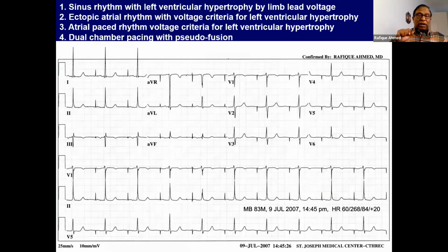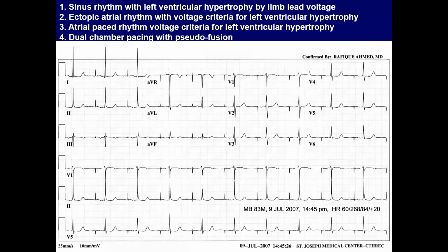Okay, this one, I want the poll. This one.